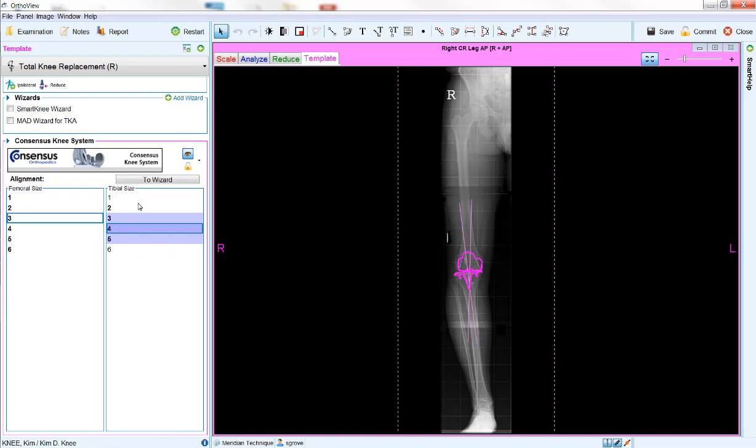You may pick any value from the largest to the smallest in the settings on the left hand side. However, there may be some restrictions imposed on your choice by the implant manufacturer. These restrictions are identified in a lighter or non-bold font. If an invalid option is chosen, for example a size mismatch, the template in question disappears and a warning message is displayed in its place.